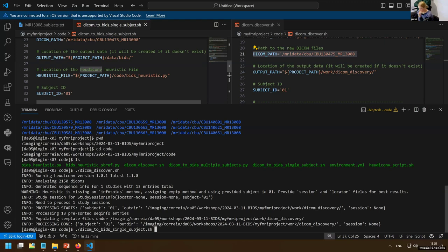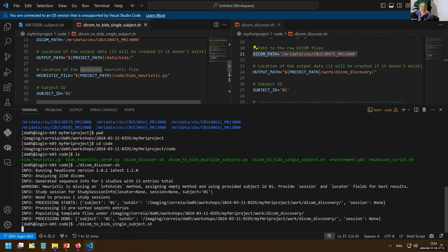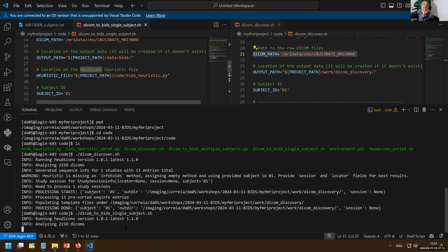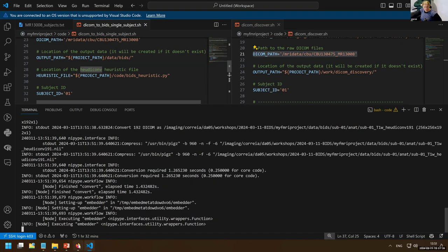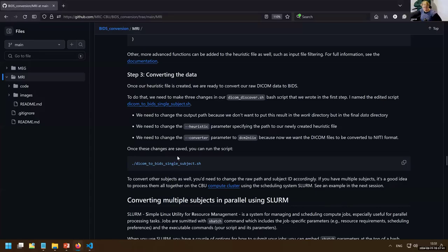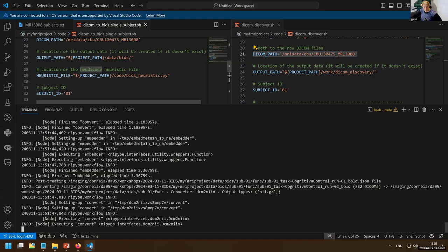So that is a bit single subject. Fingers crossed, so it's now analyzing. Yeah, as I said, it should be pretty quick for one, but yeah, in my tutorial I have described all the things in more detail, so I'll put some links, so please have a look through that when you get started.